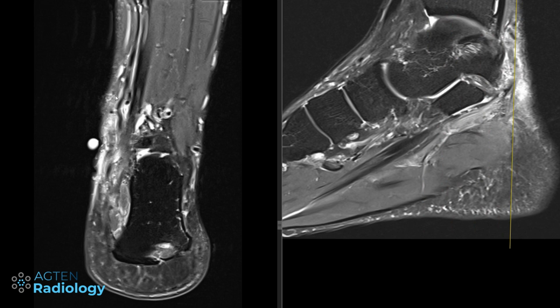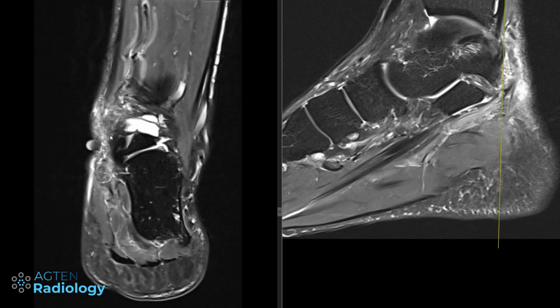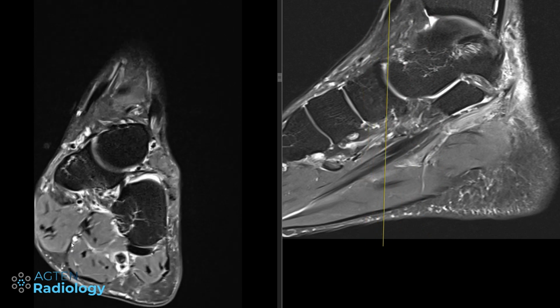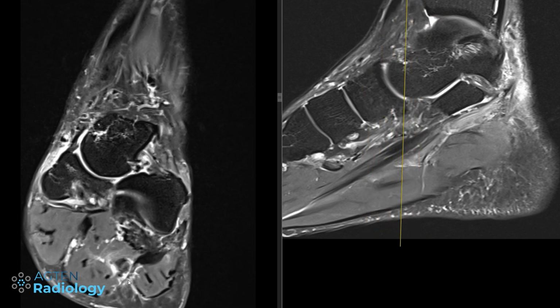So again, marker here, we can see some flow voids happening also, first of all, in the artery itself, the posterior tibial artery, and the corresponding two veins. Then they go into the tarsal tunnel. And then, up here, they split up into the lateral branch that's going down here and into the medial branch, or medial plantar vein. So medial plantar vein, lateral plantar vein. And you can see the diameter is thick.